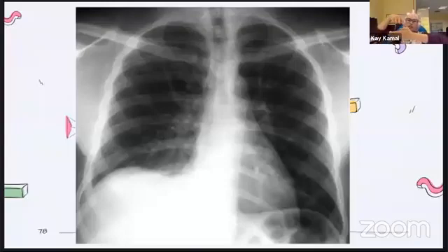So when you shoot like that, this is the abdominal wall, the upper abdominal wall, and imagine this is the liver. If suddenly you find there's a gap of air there, then you can be almost confident that it is pneumoperitoneum in that patient.